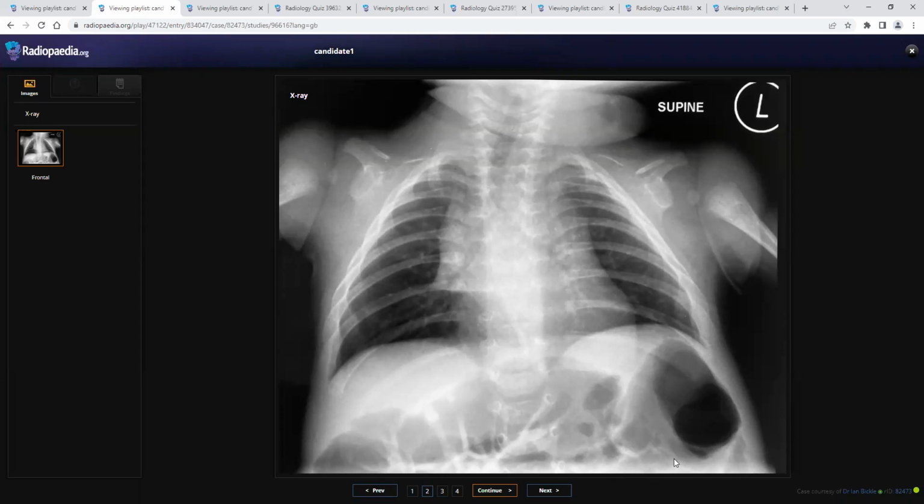Okay. The cervical spine, I think there is widening of the interpedicular distance. That's okay. That's normal. I couldn't appreciate significant abnormalities. Sorry for that. Okay. We'll stop this. So we'll review the images, the cases now.